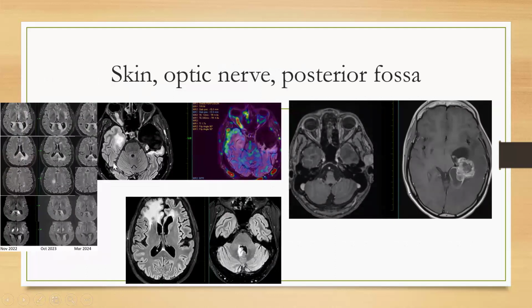And this is one case of IDH mutant grade 4 astrocytoma. This was treated two years back, and the patient was fine. But now, after two years of treatment, we saw an optic nerve thickening with raised perfusion. The remaining part of the tumor was hypoperfused because of the treatment, but there was a focal thickening, and this is actually the astrocytoma spread to the optic nerve, which is very unusual.